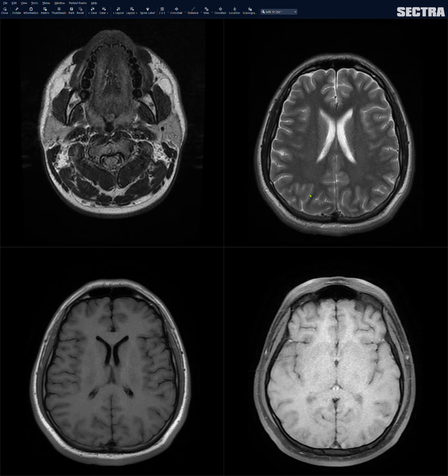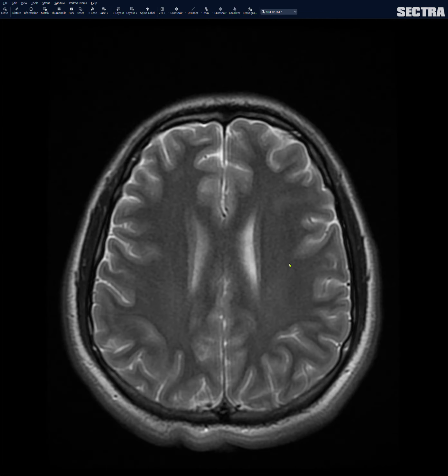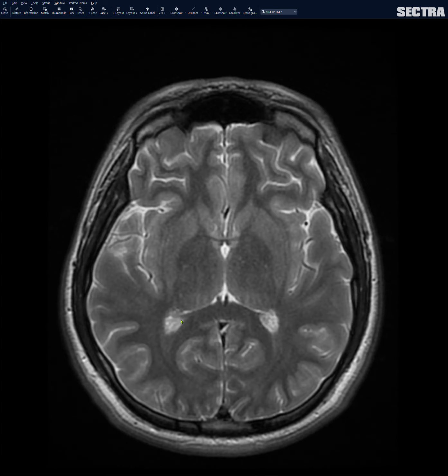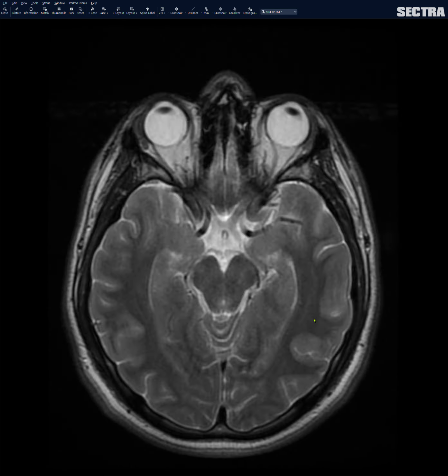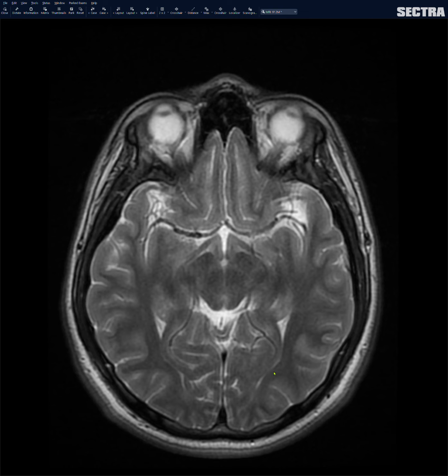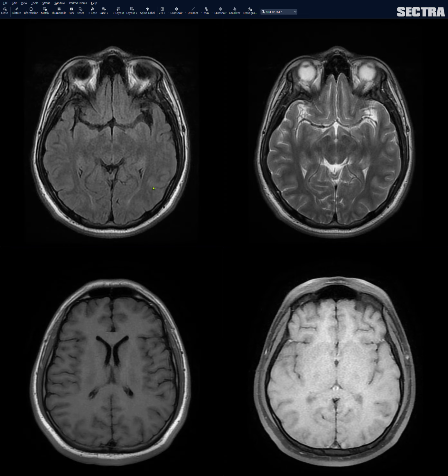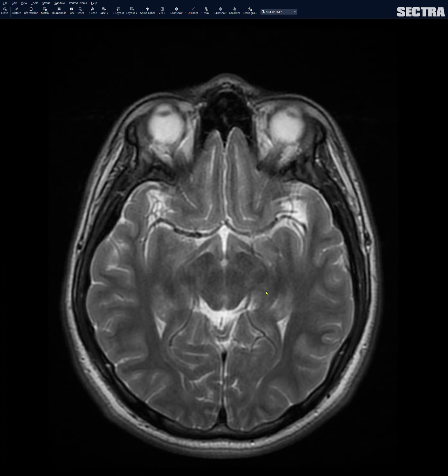After that, we go to our T2. So I kind of read it like a CT where I start centrally. I look at the size of the ventricles, look at the occipital horns. Sometimes you can see blood layering inside the occipital horns, so you definitely want to watch out for any blood there. And you can also sometimes double check the occipital horns on the T2 FLAIR too for any layering of blood if you think you see something on the T2.